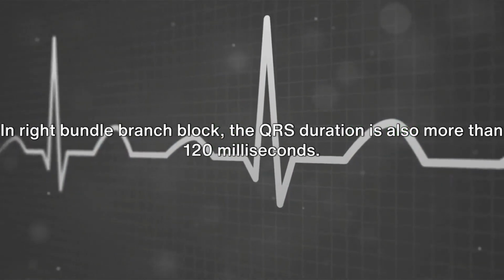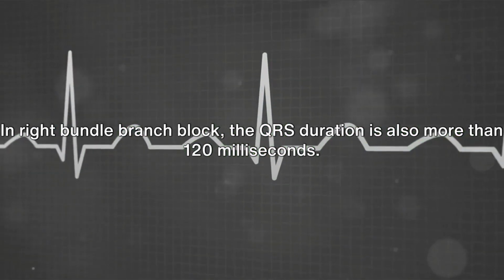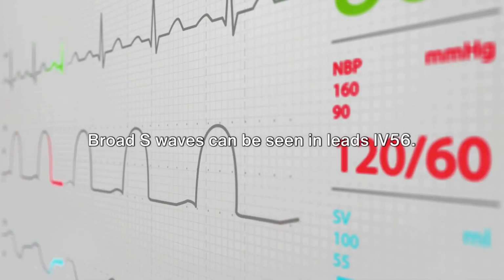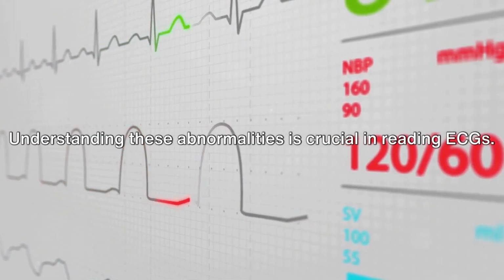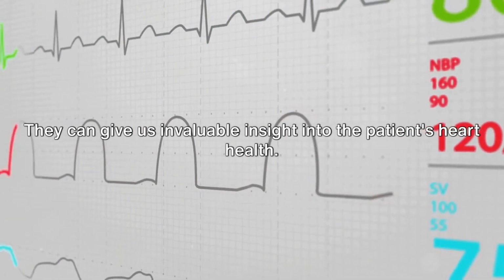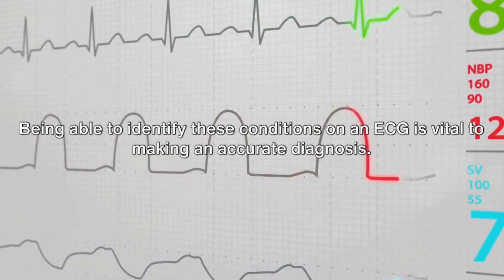In right bundle branch block, the QRS duration is also more than 120 milliseconds. The QRS in lead V1 is positive. Broad S waves can be seen in leads I and V5-6. Understanding these abnormalities is crucial in reading ECGs. They can give us invaluable insight into the patient's heart health. Being able to identify these conditions on an ECG is vital to making an accurate diagnosis.